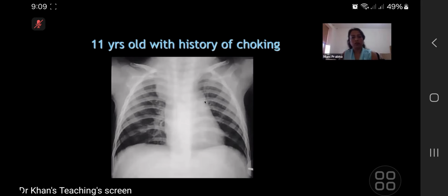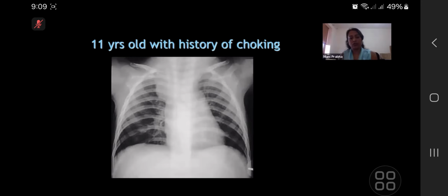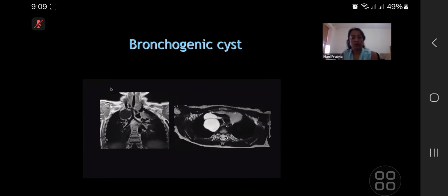It can be a duplication, a foregut duplication cyst category. So it could be esophageal. So we'll move on to the next examination, because obviously X-rays will be quite limited in what information we can get, and the best examination would be a CT scan or MRI scan.